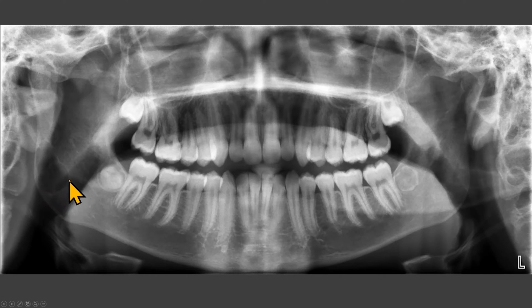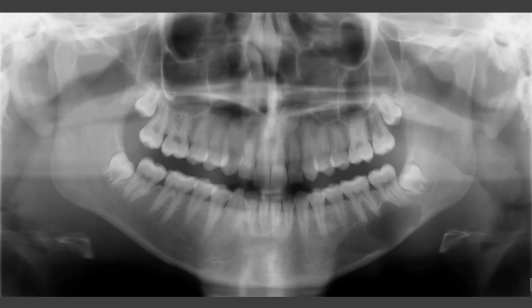Here is a simple bone cyst in the right ramus. The third molars are incompletely formed, about 17 years age. Here is a simple bone cyst in the left molar region. The defect is scalloping between the roots. The third molars are again incompletely formed, about 17 years age. The first and second molars are not displaced. The defect is longer mesiodistally than being circular.